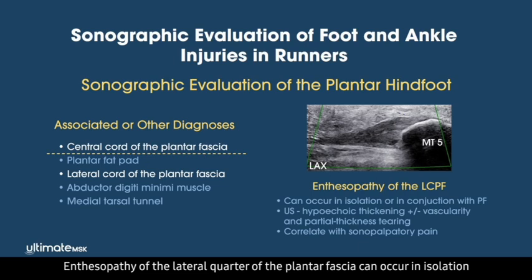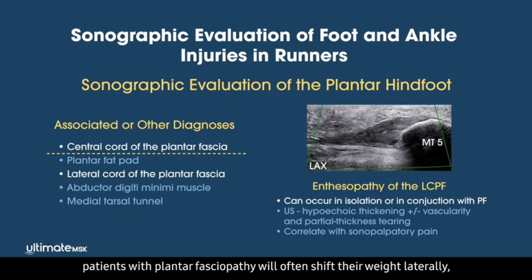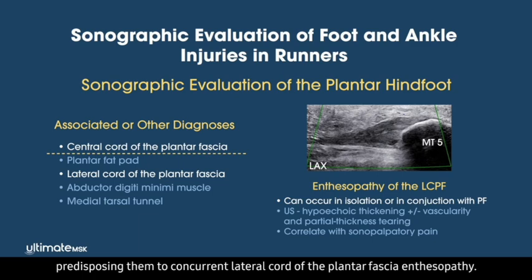Enthesiopathy of the lateral cord of the plantar fascia can occur in isolation or in combination with plantar fasciopathy. Because the central cord is a relatively medial structure, patients with plantar fasciopathy will often shift their weight laterally, predisposing them to concurrent lateral cord of the plantar fascia enthesiopathy.